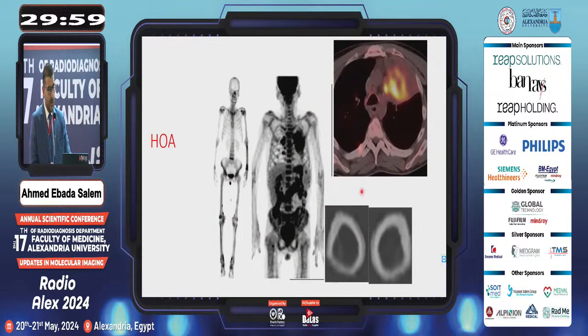This is another patient who had squamous lung cancer. They had a tumor, and they had bilateral lower extremity pain. So their symptom initially presented was bilateral lower extremity pain. As you can see, this is the bone scan. You can see there's increased activity related to the anterior tibia bilaterally. It does also correlate to increased areas of uptake on the PET-CT, and you can see periosteal reaction on the CT portion. So this patient had a paraneoplastic syndrome.